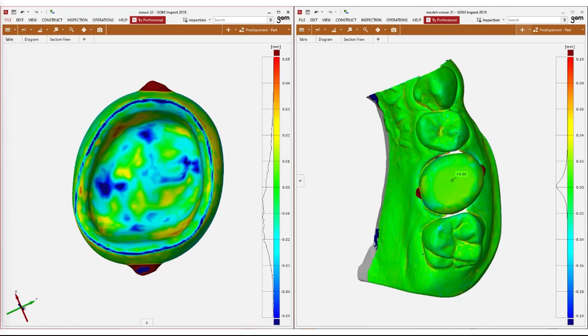The photo on the left shows the scan data of a crown that was machined with an additional cement gap in the line angles, compared with a redesigned file with a uniform 30 micrometers cement gap. The result shows that a uniform cement gap was achieved. The photo on the right shows the machined crown positioned on the model, and a comparison between the scanned file and the design file shows a vertical error of about 10 micrometers. It went in all the way.